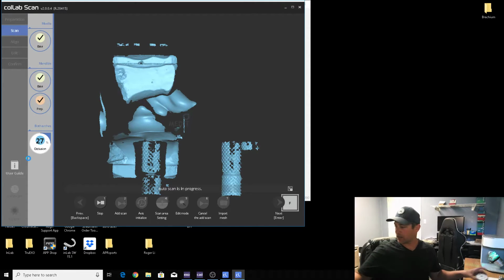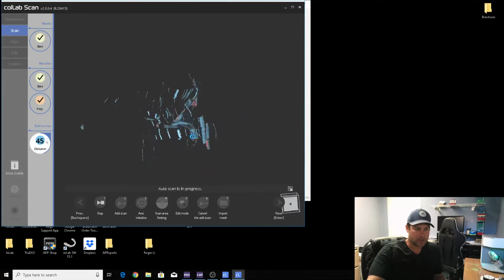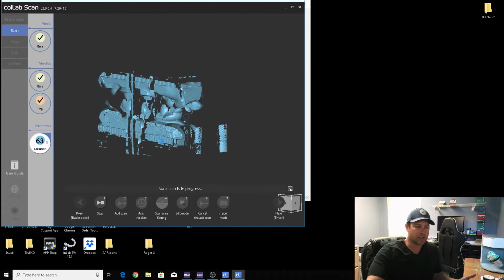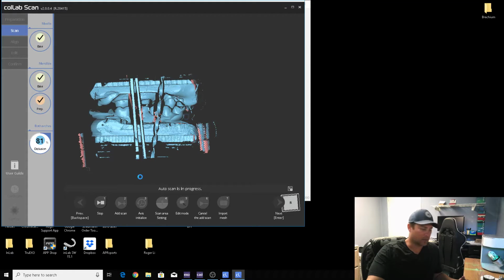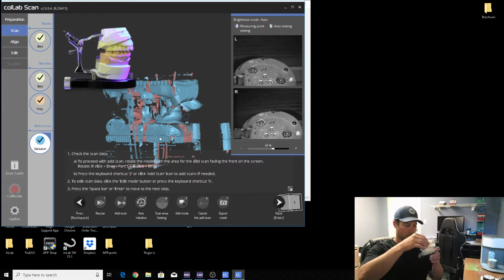Good, put everything back in the case pan. Clean up so you don't leave things behind. Sometimes the scanner kind of malfunctions. Not really a bad thing. If it was on a normal model scan, I would rescan everything and start over, but since it's just the occlusion, it's not going to be that big of a deal, so I'm not too concerned about it. Usually that happens if there's a small movement in the cast on the plate and it wiggles a little bit, so that's what that is.